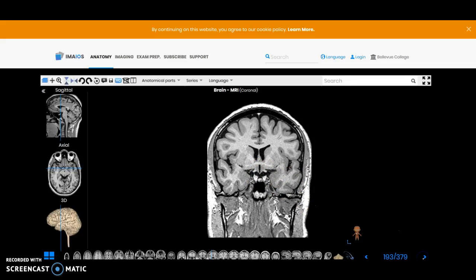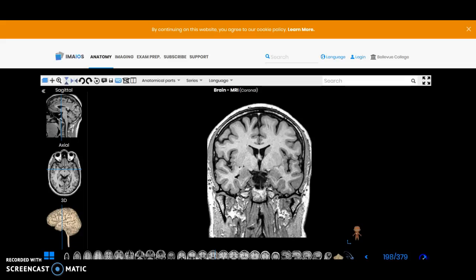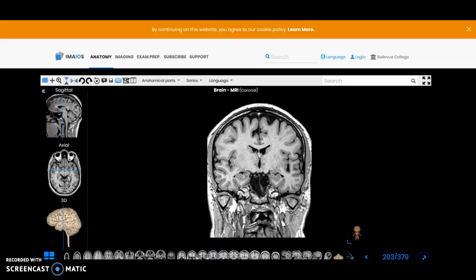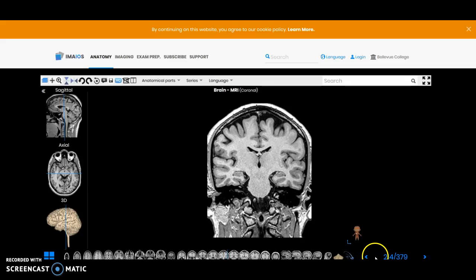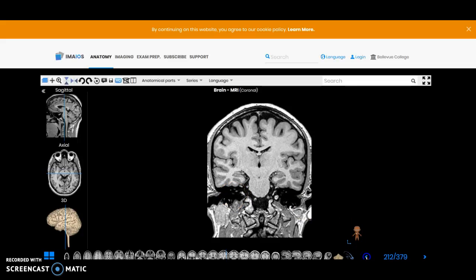And then as we go more posteriorly than that, we're going to be able to see the 7th and 8th nerves. They are not as easy to see on this MRI scan. We didn't get a very clear picture just because of the angle of the patient, but here you can see the 7th nerve goes more superiorly and the 8th nerve is more inferior. Maybe on the other side we catch it a little bit, no, not too well on that other side.